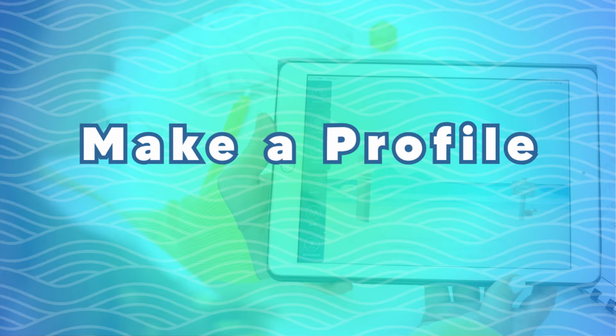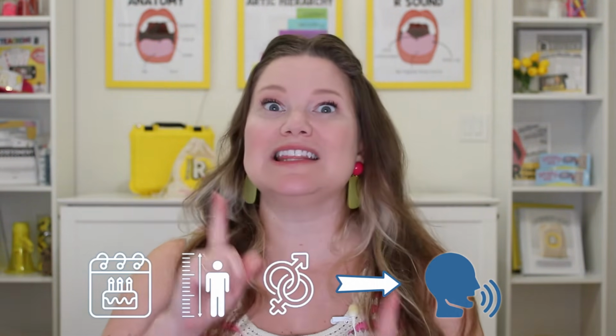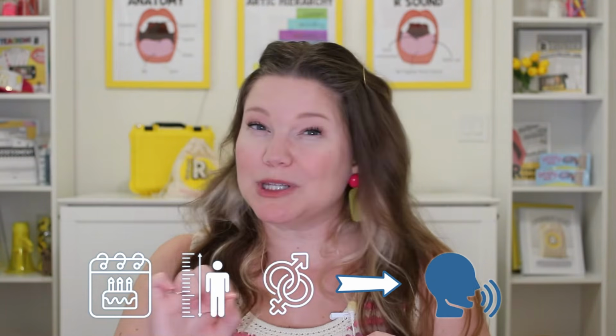Once you've downloaded the app, you're going to create a profile for whoever is going to be targeting the R sound. The app will ask you to put information in about their height and their age, things like that. This is going to help the app calibrate to their vocal tract, so it knows where to put the marker for our R sound, and I'll show you more about that in a minute.